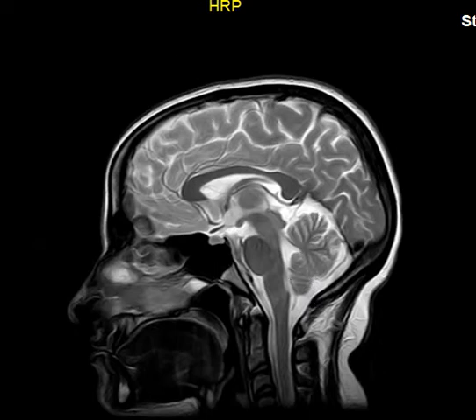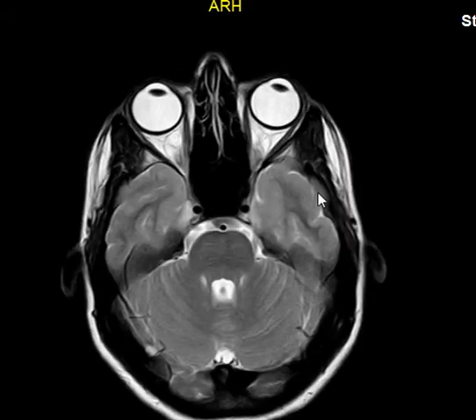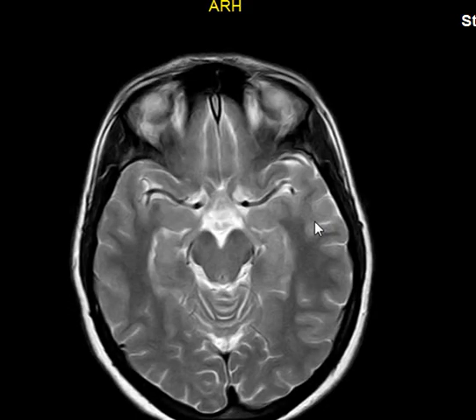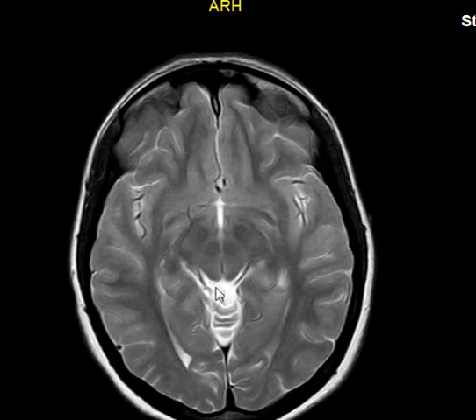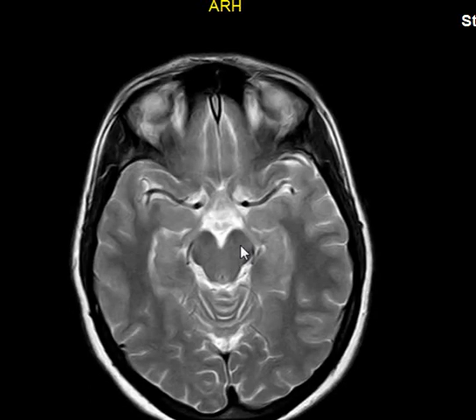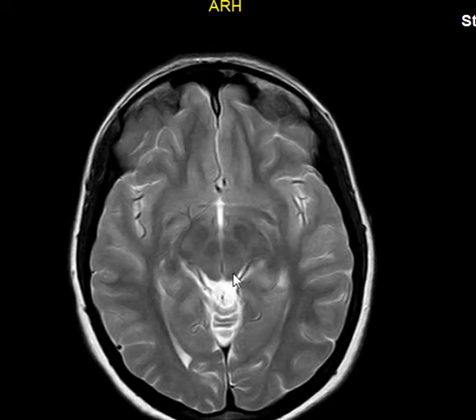So let's see what we can see of this in the axial image. First of all, we start from above, the midbrain. The midbrain connects to the cerebral hemispheres, right and left, by the cerebral peduncle or crus. That's the same. Usually they call it cerebral peduncle. You can see the right and left cerebral peduncles connecting to the cerebral hemispheres.